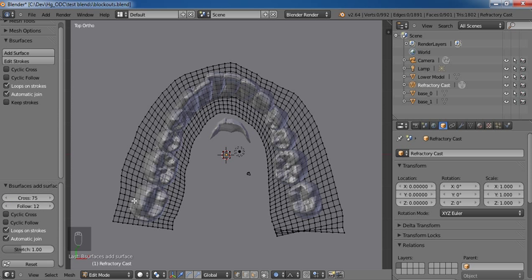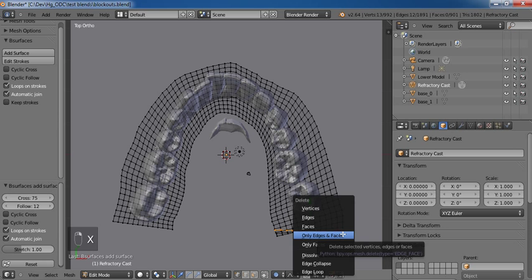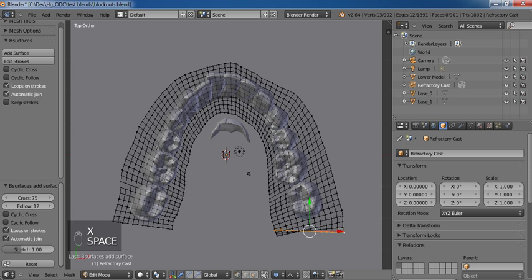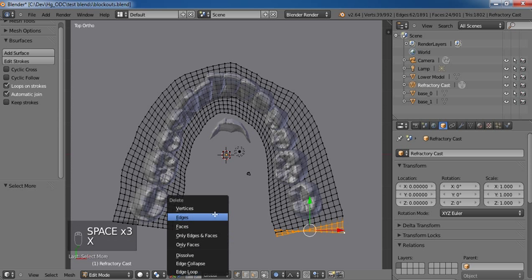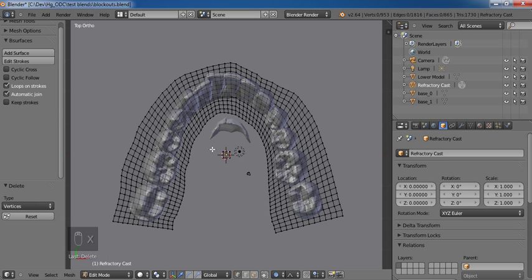You just want a more or less uniform grid here. Right? If you see anything crazy like this happening, just delete those or draw your thing again.